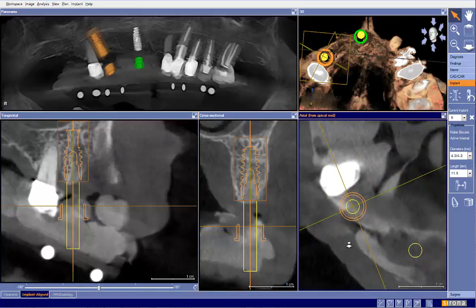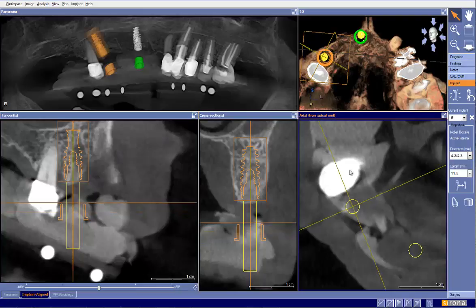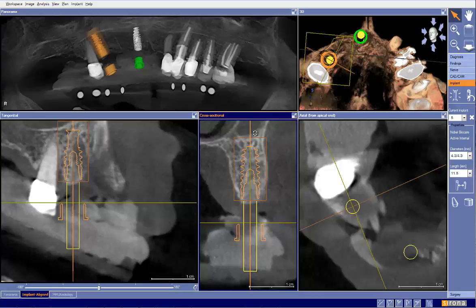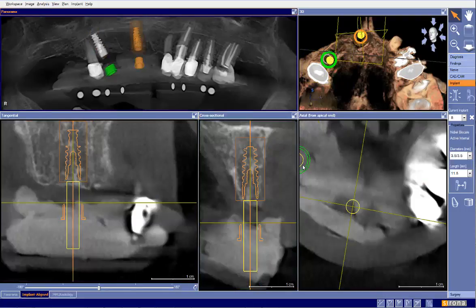Again, angulation. Based on what I'm seeing here, we can see we're in the center of the tooth with locators. I actually err on the side of being to the lingual of teeth. And that gives me my housing through the lingual cusp that gives me more room for a tooth on the buccal so that we don't have to suddenly make a short tooth to be able to house the housing. I don't know how that came out that way.